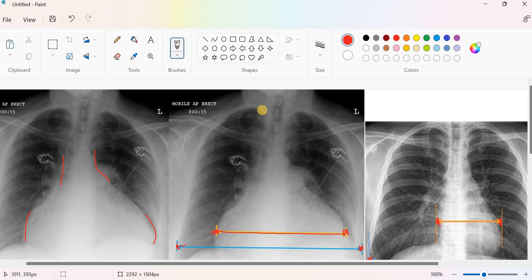It might be due to many things. So now we have covered together the abnormal features that you might see in a chest x-ray due to an enlarged heart, whether a discrete enlarged chamber, like the left or right ventricle or atria, or the whole heart enlarged like pericardial effusion.